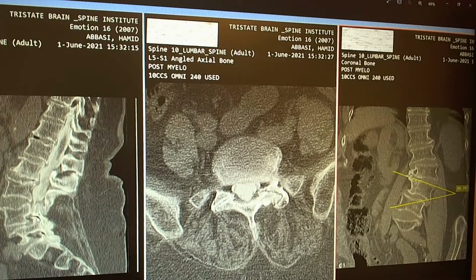But there is so-called mechanical decomposition, like if you hit a normal tissue hard enough, it mechanically decomposes. The nitrogen from the protein gets released, and that's what you see here. You see a mechanical decomposition of the disc or facet. This is a degenerative sign, not a bacterial decomposition.